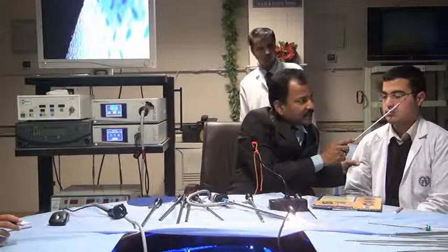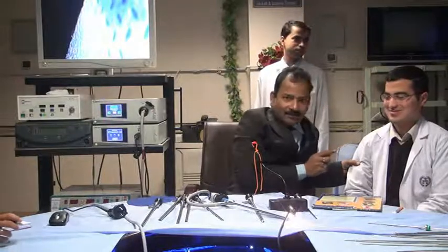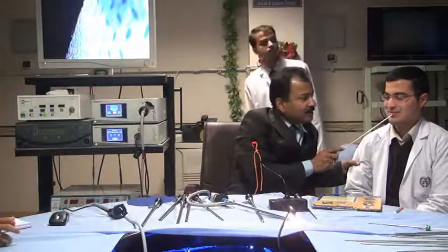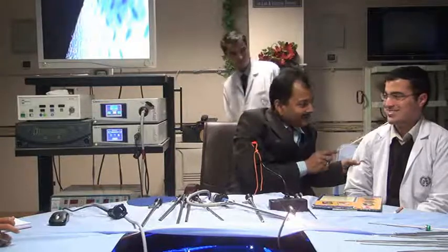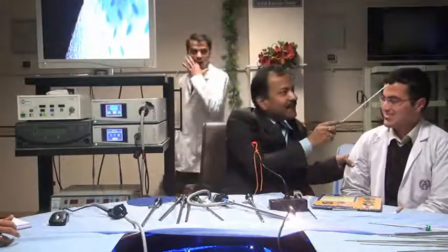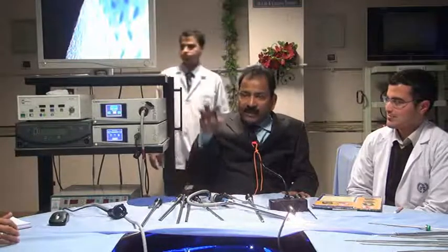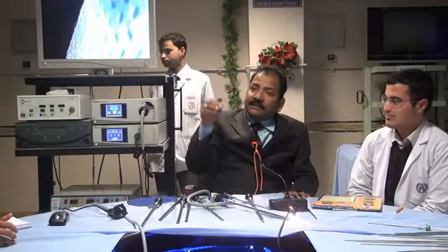The shadow of his specs is here. The shadow of his nose is here. And see that? The shadow on his lower lip is here. The shadow of his hair is here. Can you see the shadow? Yes. Shadow gives you beautiful depth perception. Once the light goes from some angle, then there is shadow.